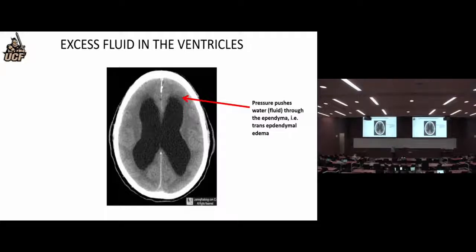In a situation in which you have many different cuts of this, radiologists on their software can make it darker and lighter. I could do it in PowerPoint, but it would take a long time. You can sometimes bring the contrast out better, but do you see that sort of thing pouching out from the ventricle? Yeah, that would be an example of transependymal edema.